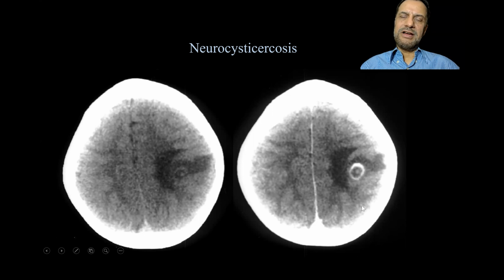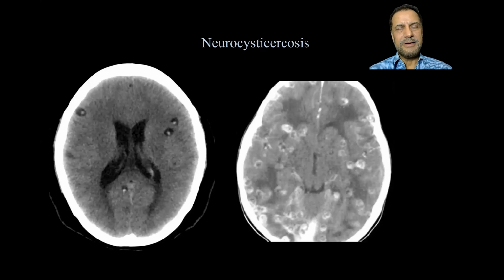And this cyst is already dying. It's a solitary single cyst, and the chemical has gone out, so there's an edema around it. And these are the times when they present with seizure and come to you for treatment. And you see something like this.